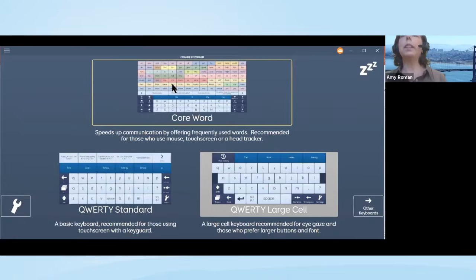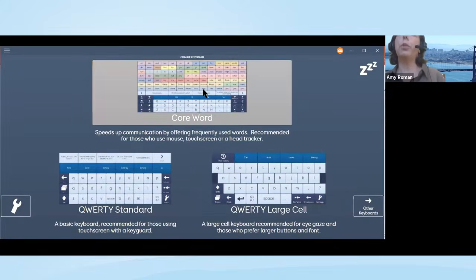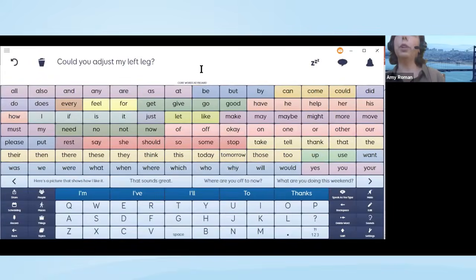We set the mouse speed to very high, and they are very accurate. A lot of people with ALS tend to be very accurate. We just want to minimize the amount of work they do, the effort, the range of motion. So if you speed the mouse up, a lot of times they don't have to work as hard to get it to the different corners. So that's very helpful.